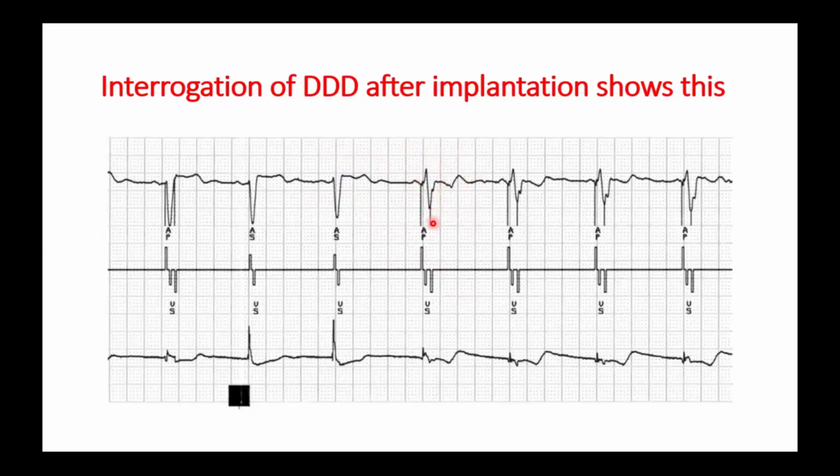And this is actually ventricular safety pacing. The clue is that the atrium is actually sensing the ventricle and it captures the ventricle, so it's actually in the ventricle. And here is a pseudo-fusion beat. The pacing spike is before the QRS complex, however there is no change in the QRS.